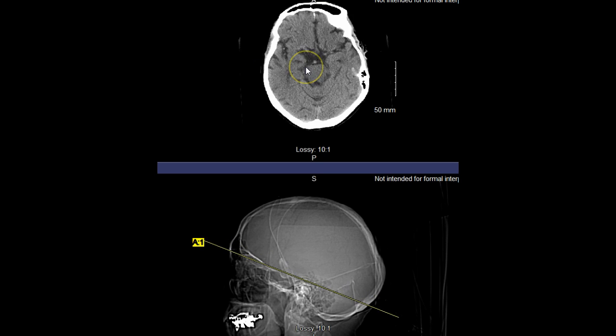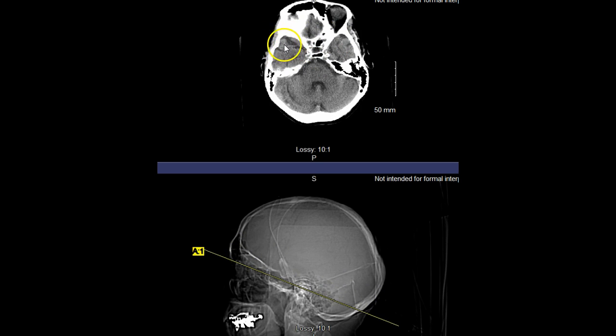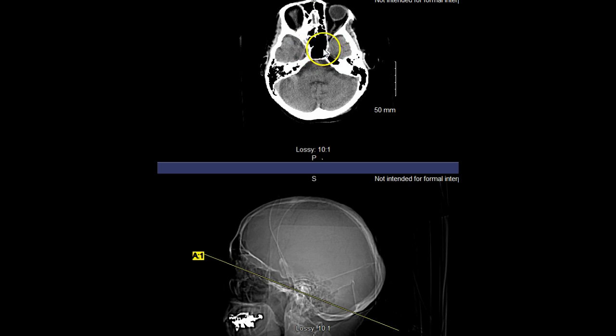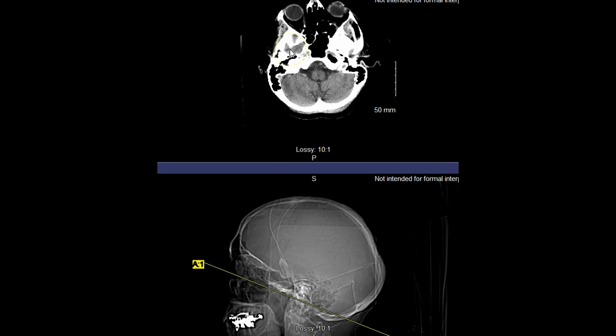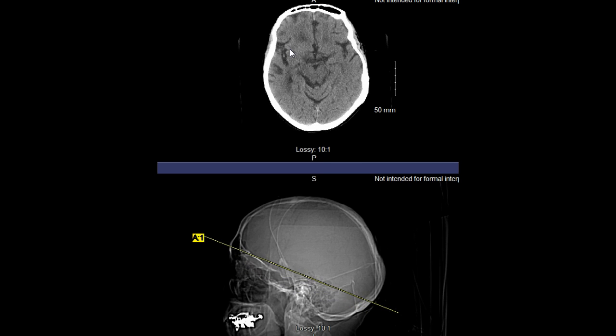So the insula lobe. And then in regards to the floor of the cranium, where you can see some of those bony-based structures in the midline, you can see the area of the sphenoid sinus. On both sides of that is going to rest the temporal lobe. So we can think, all right, here are the temporal bones. We can see the petrous portion associated with the temporal bones, or the mastoid air cells there as well. So that's going to be a key, so definitely know that area as well. In a nutshell, those are the major structures that you're truly going to need to know.